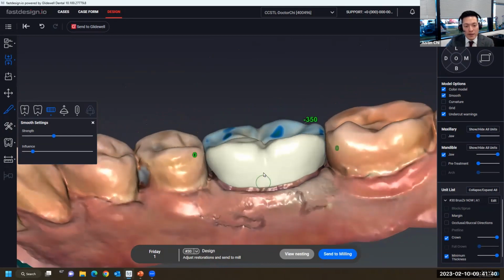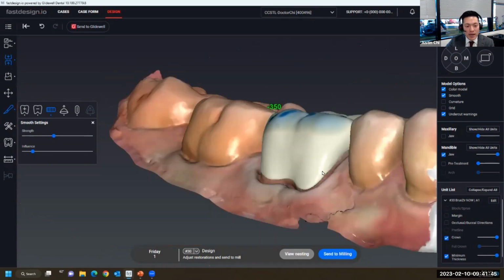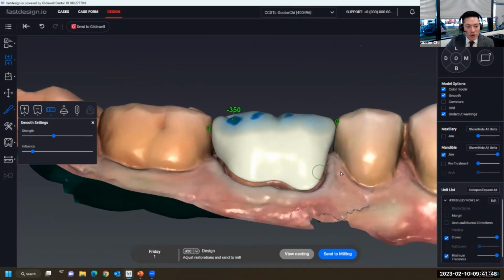All right, so once the occlusal surfaces are set, those occlusal embrasures, I mentioned emergence profile. That was kind of evaluated at the initial when we looked at the design. The emergence profile is heavily dictated by your margin and your preparation. Wherever that margin is, that's where your design is going to emerge. Now, if you have a more periodontally involved situation, or you're trying to expand or close a diastema, especially in the anterior, you might want to consider dropping that margin down a little more apically, because if you drop it more apically, that emergence profile has a chance to emerge much lower from the gingival areas so that you can create a design from that position, much lower.